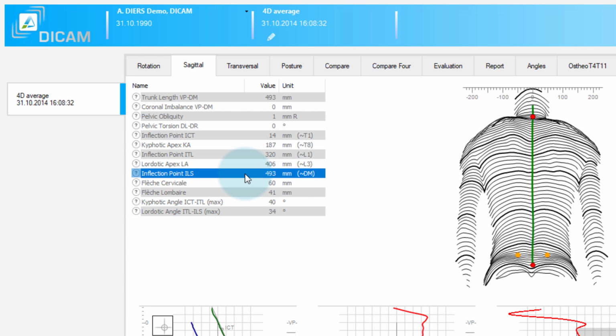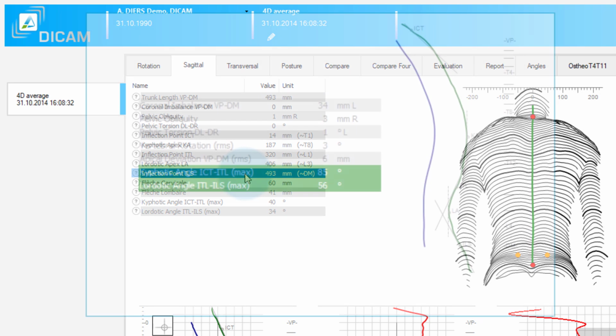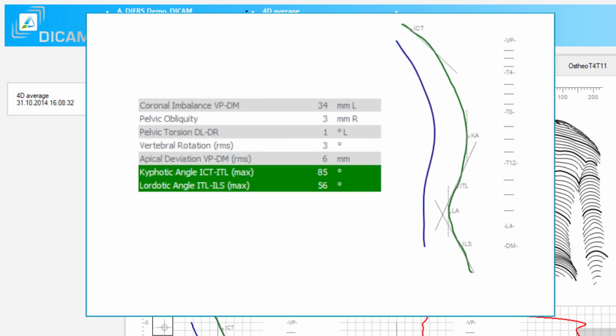M. A deviation from the above segmental position indicates a functional shortening or lengthening of a curvature. This can have noticeable effects on the sagittal load distribution. If, for example, the kyphosis apex is not found at T8 but lower at T10, this will also shift the point ITL caudally. The first logical response will then be to derive a higher kyphosis angle.